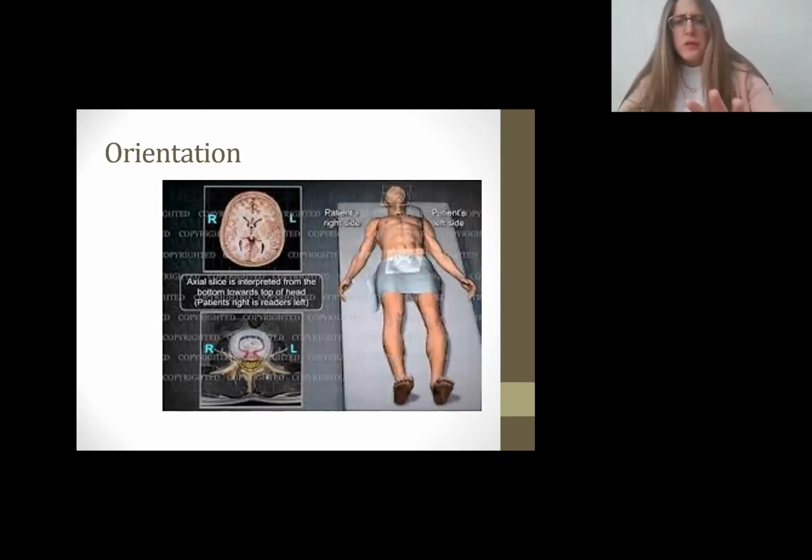I know this image is blurry, but I did my best to procure at least a slide to help you understand the orientation. Whenever you look at a CT image, there is a right. The right is on your left and the left is on your right, just like the X-ray, for example. Why I'm saying that is, first of all, I memorized it, but then I found myself, on post-call days, on those tired days, I would forget it. So I decided, hey, I want to understand it.